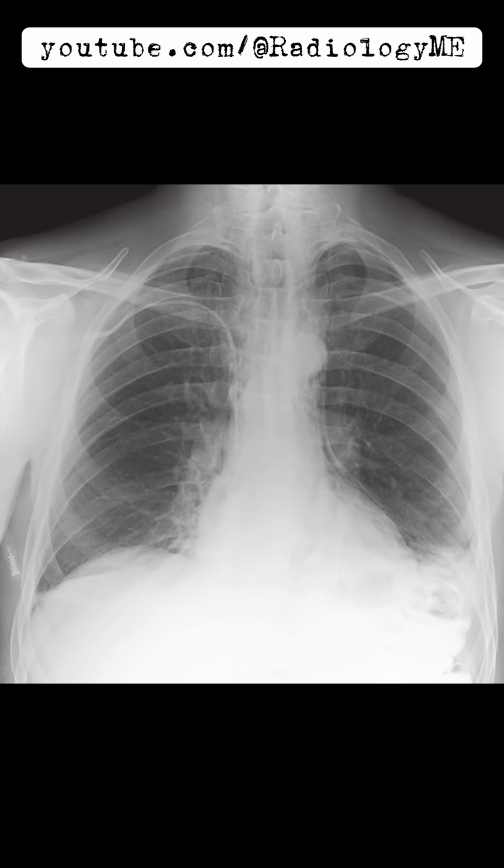We've got a chest radiograph of a skeletally mature patient. At first glance, what jumps out is the right-sided subclavian venous catheter, which looks to be in a satisfactory position in the lower superior vena cava. No issues there. But immediately I notice something unusual.